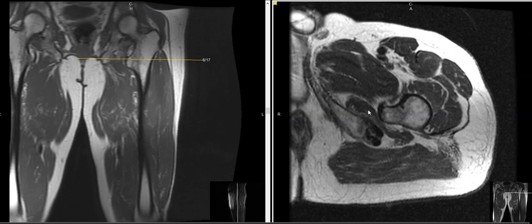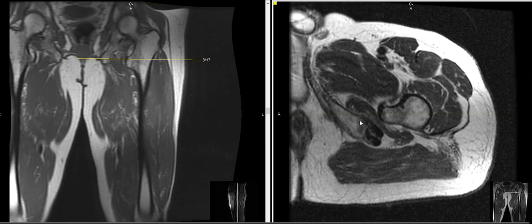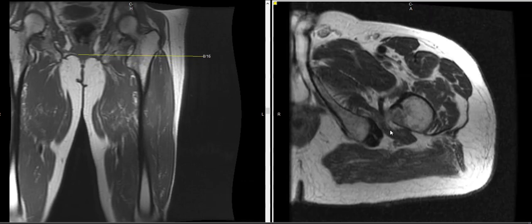Normally there's a pretty good space in between here, and in this patient the space is very narrow. We see the muscles getting flattened and compressed a little bit. So we call this ischiofemoral impingement. So the ischium and femur impinge upon this quadratus femoris muscle. Sometimes it'll cause the muscle to become atrophic or edematous. Sometimes it'll even cause it to bleed. But this is right in the area where they're having their symptoms.